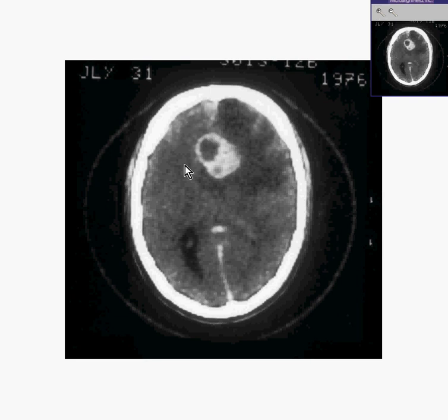It's almost like it's growing so fast that the central portion may become necrotic and less dense, because this is a very quickly growing brain tumor. This is a very malignant, therefore, brain tumor. It is not a low-grade glioma. This is a glioblastoma multiforme, which is synonymous with the term high-grade glioma.